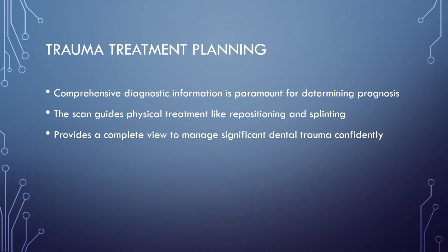Ultimately, taking the time to extract this comprehensive 3-dimensional diagnostic information from the CBCT is paramount for determining the prognosis and formulating an appropriate, effective treatment plan for the traumatized patient. The scan dictates your clinical steps.